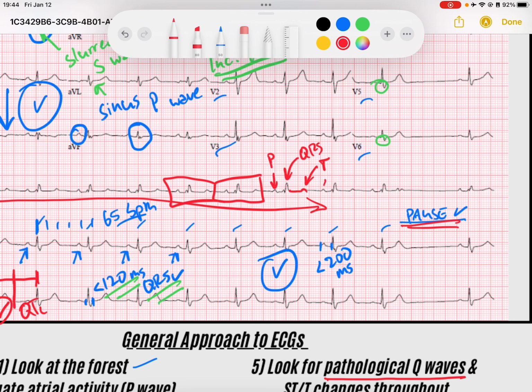So I've got my PQRST, PQRST, and then my pause. And I say, okay, what is different? Can I look in front of the pause and say that there is a difference? And if you zoom in on our T wave here, you can see that the normal T wave in the previous beat is just smooth, but this T wave, instead of being smooth, has this sharp notch, and that notch is an atrial depolarization. That is a premature atrial contraction that caused atrial depolarization.